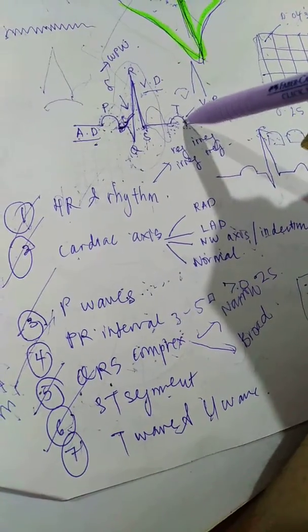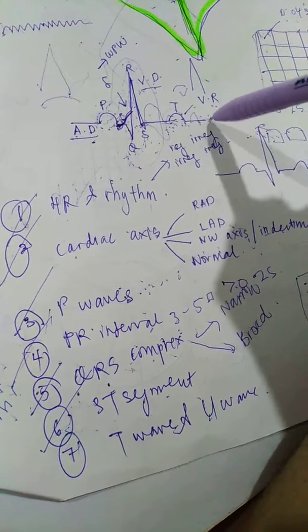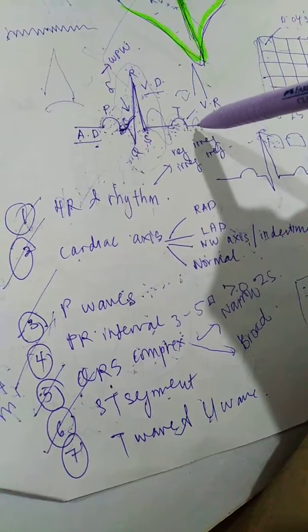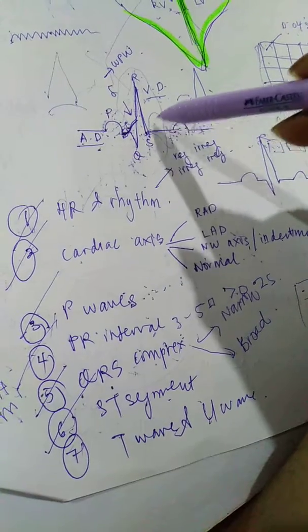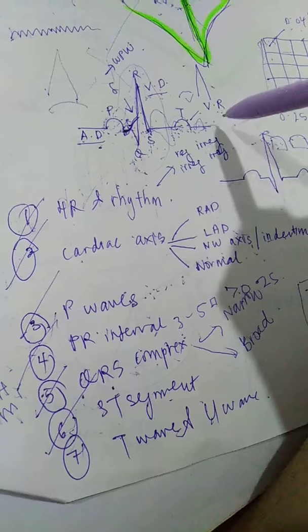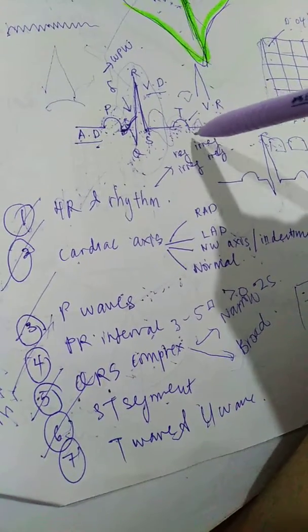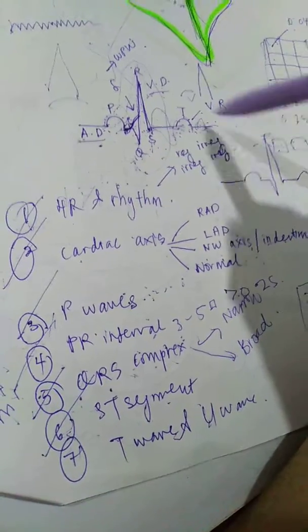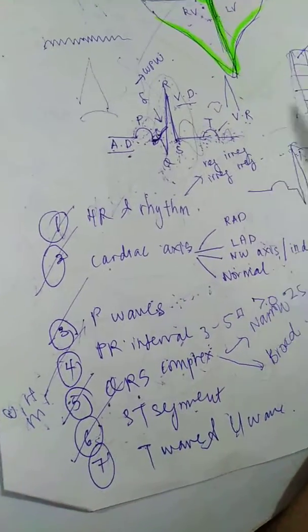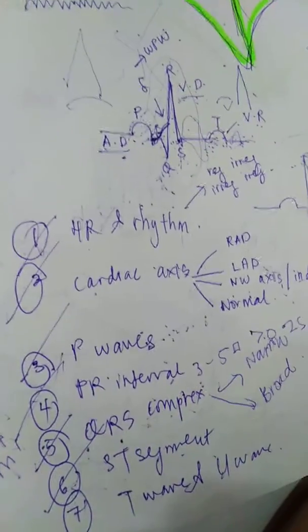Looking into your T waves, you need to look if they are present or absent, or sometimes even at the morphology of the T waves by itself, if they are flattened, if they're depressed, or if they're even pointed. Usually these pointed T waves are associated with hyperkalemia, metabolic abnormalities. Or sometimes you have very tall T waves, which could even show a hyperacute STEMI as well.